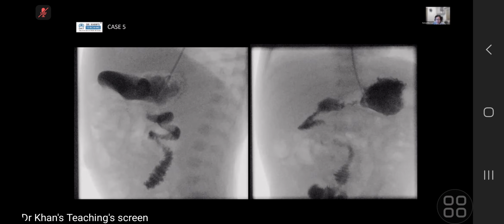And why you say it's volvulus is because you can see this corkscrew pattern of the bowel loops on the sagittal film, less well seen on the AP. But definitely what you can see is contrast going into your first part, second part, third part. You don't really see where the fourth part is, and then you see contrast going further down. From an experience point of view, it's really hard to get. Often when you see malrotation, you have to purposefully wait or give extra pressure when you push air into the syringe or the NG tube, just to push contrast through to demonstrate that corkscrew appearance.